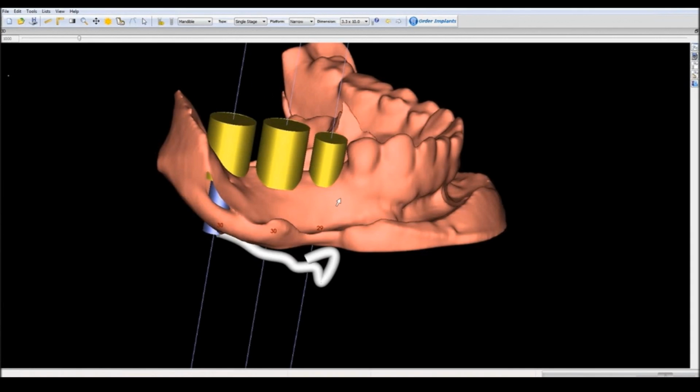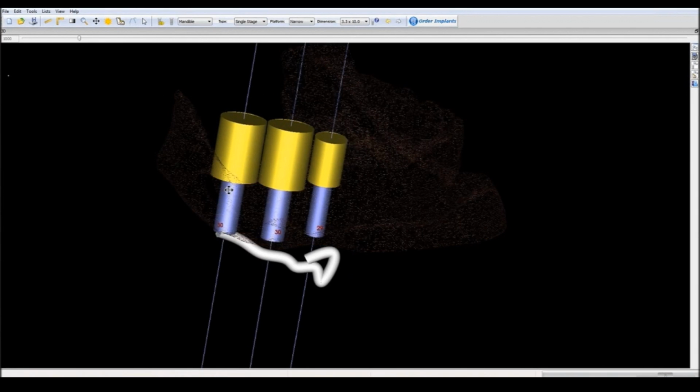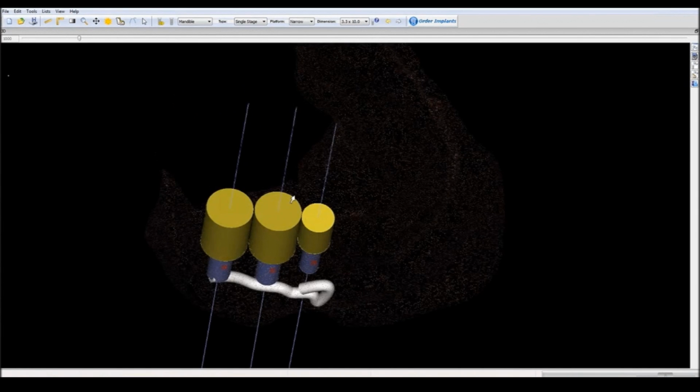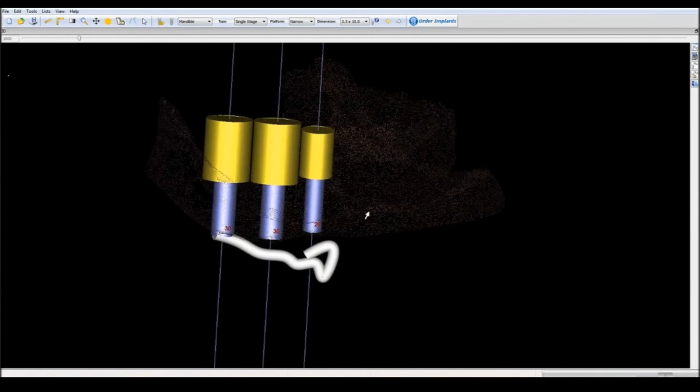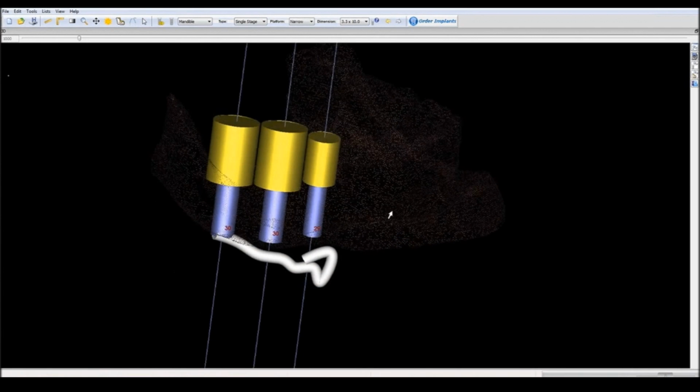When you do implant planning, it's a three-dimensional exercise, but you plan it one dimension at a time. So right now we're working on mesial-distal. So I can bring this first molar here, second molar here, and I can have an ideal relationship between these implants.